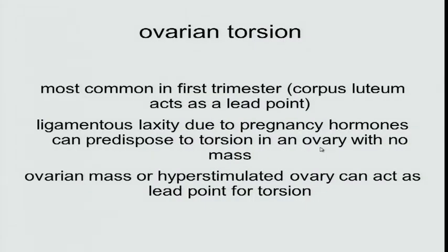Okay. Whenever you have someone who's pregnant like this, can you still call pelvic congestion syndrome? I would be really careful about calling that during pregnancy. I would wait 6 months or a year after and see what it looks like, because you don't want to go in and embolize somebody based on what you see. Everything is dilated and it's not good. Yeah, don't go there.